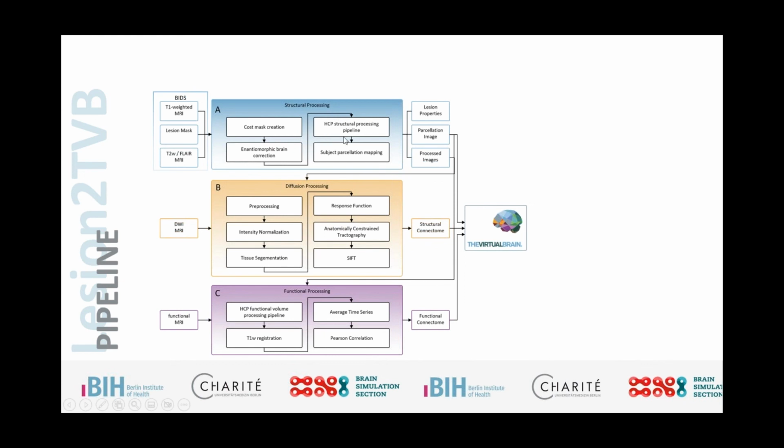So then we're pretty much back to the standard Human Connectome processing pipeline, because we're talking about now healthy brains, and this is the gold standard that we want to do. At the end, we are running our own parcellation mapping.